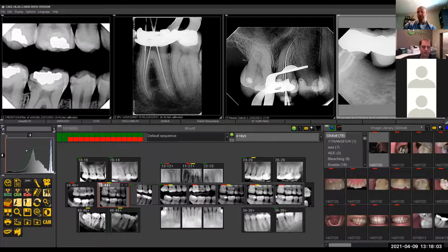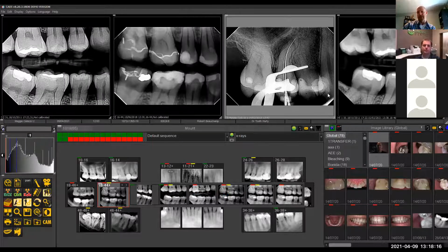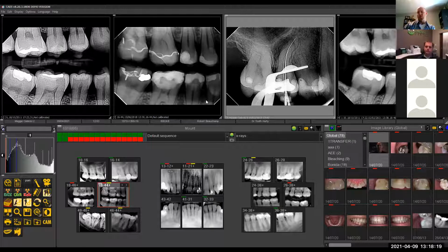It tiles them all out by date. So now I can easily see, okay, this was 6 months ago, this was 12 months ago, this was 18 months ago. Then you just double click, and you get them all up side by side. Now you can view your last 18 months, 24 months of the bitewing history to see how things are progressively getting worse or what have you. That's how we have this historical quick view, which Dennis loved.